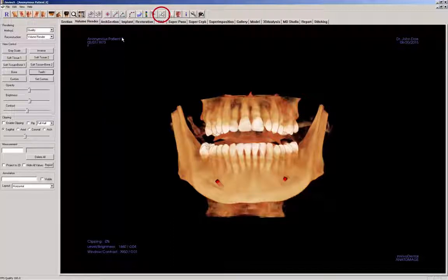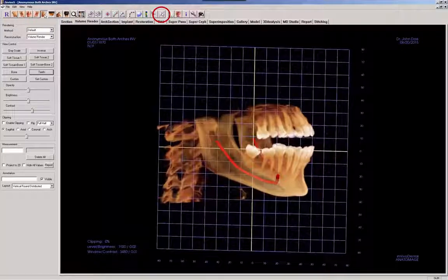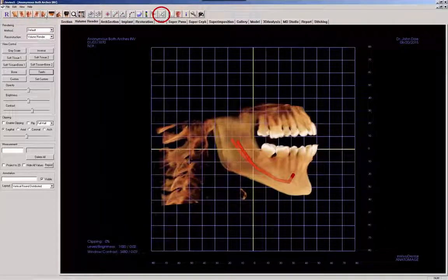Let's shift our attention back to the toolbar. By clicking on the Quick Measurement tool, a ruler will be placed at the cursor tip so it may be dragged to an area of interest for a quick assessment. Click again to turn it off. A grid tool allows you to toggle between 4 different grid layouts for simple assessment of size, measurement, and spatial location.